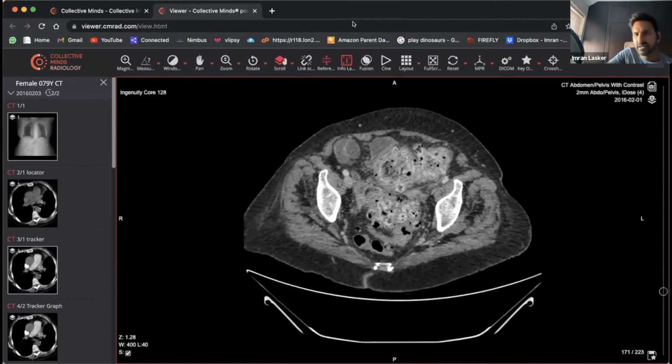The interesting thing about this is that you could have someone that's got a defunctioned large bowel, and you can still end up having this, because you can still get some material being produced within the colon, because you've still got secretions happening, still got some impaction of secretions. And as time goes on, that can get really impacted, can get calcified, can get hard, and then they can end up having inflammation of bowel that's not even in use anymore over a long period of time.